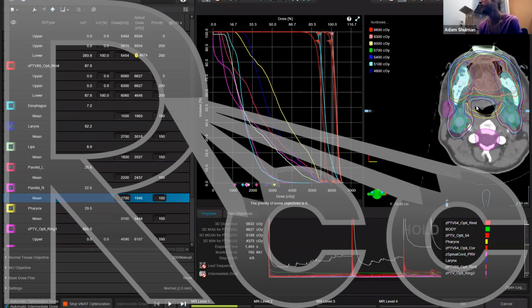The main thing is that you just don't want 0. I'd say a minimum of 10 degrees. And you don't want 0 because of leakage radiation through the MLCs. That can be a little bit different when you get into SRS and SBRT, just because of the small field sizes, but for non-SRS, non-SBRT, something at least greater than 10 degrees.